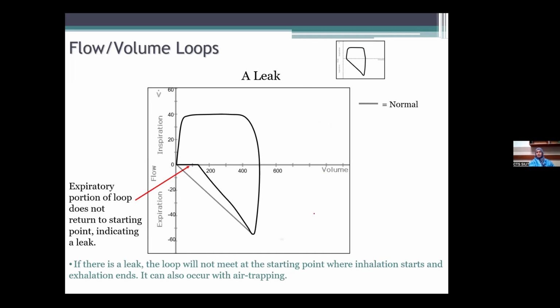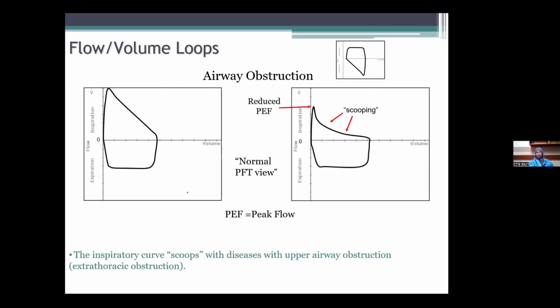And it's just going to be the very same. If it's not going to return to its initial point of initiation, it means that there is a leak in the system. And depending upon whether the leak is in the inspiratory loop or the expiratory loop, it exactly points out where in the ventilator or the patient you are supposed to look for that leak.